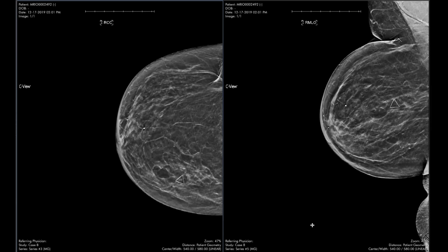This patient came in after having a car accident and now feeling a new lump in her right breast. You can see this triangular shaped marker overlying the inner upper breast, which indicates that this is the area of palpable concern. And we see this kind of focal, maybe bordering on global asymmetry in the upper inner right breast, directly underlying that triangular shaped marker. So it's sort of this whole area here that's standing out.